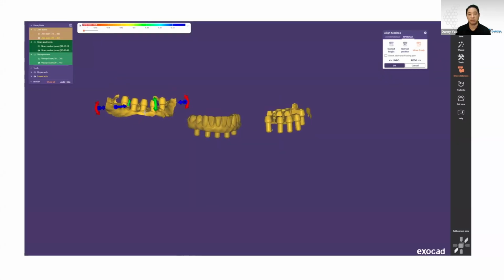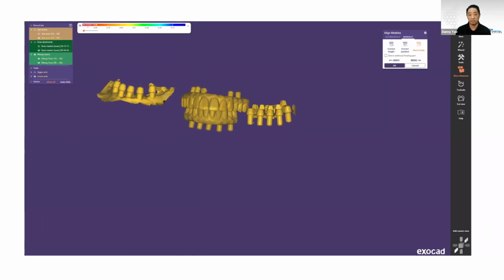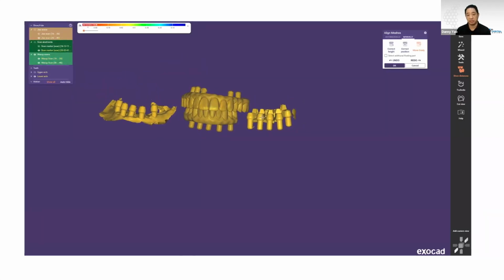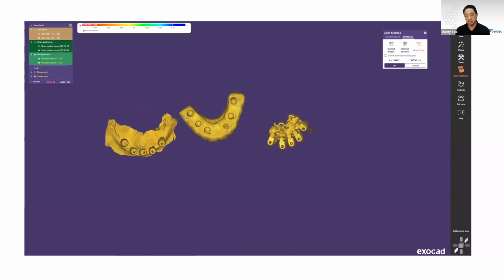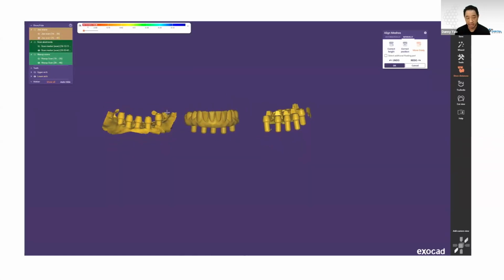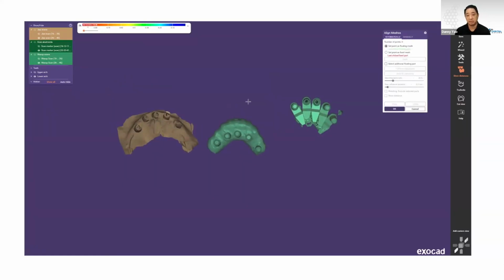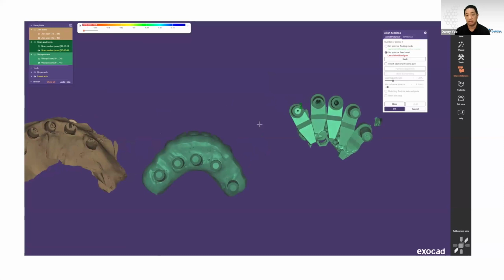So it just makes it a whole lot easier to align these three STL files, or these three pieces of three-dimensional data. And again, we're trying to align these things into the bite. Because we're using the bite right now, the bite's only common data with one of these two scans is the analog scan caps. We're going to align the OptiSplint jig first, and it's being done almost the exact same way that we did the upper.